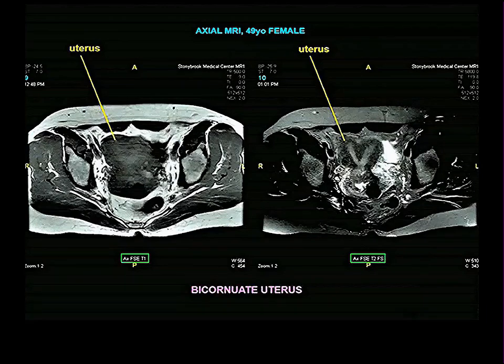What is this? This is interesting. This is what it is. I was just telling some gentlemen about the development of the fallopian tubes. Now you've all, I know, done your embryology, and you know about the fallopian tubes developing from the paramesonephric or Mullerian ducts, and how they come together as you pass inferiorly, merge with one another, and become the uterus. So there are these two tubes which merge to become the uterus.